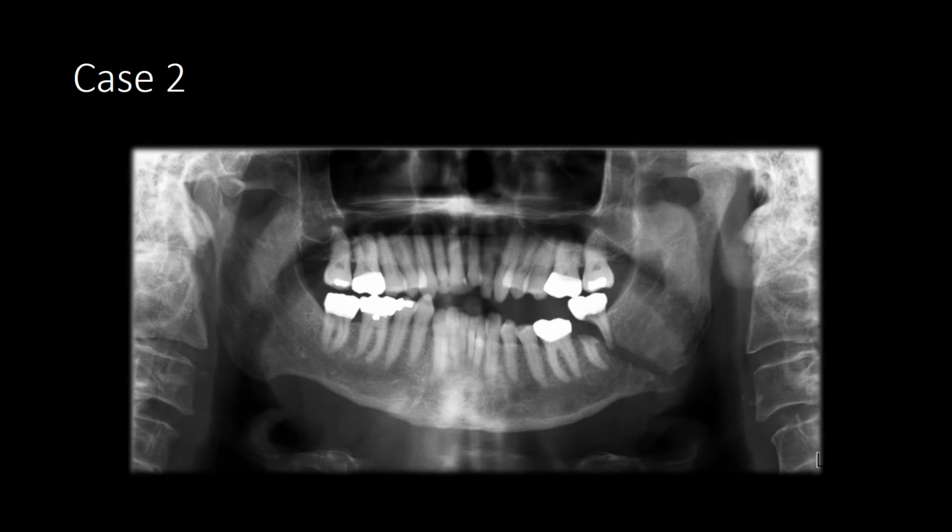Case 2. Similar case, actually, really similar case to the last one. This is another patient post-trauma. There is a left mandibular angle fracture. Again, it fractured the roots of that molar there, that posterior molar. So again, challenge yourself to find the fracture. This one's actually in a very similar location. This one looks a little different because there's some overlap of the fracture fragments, so you get a little bit of a sclerotic appearance here because of the overlap.